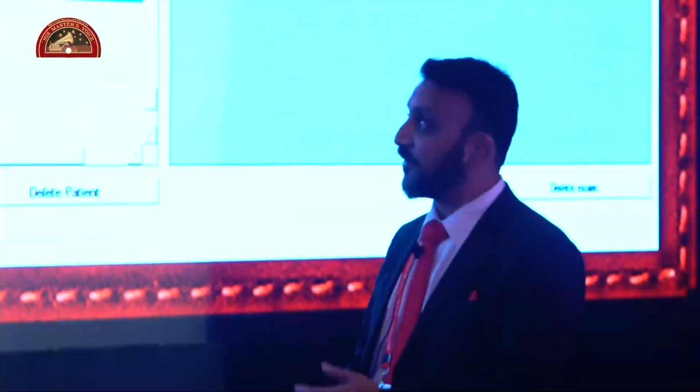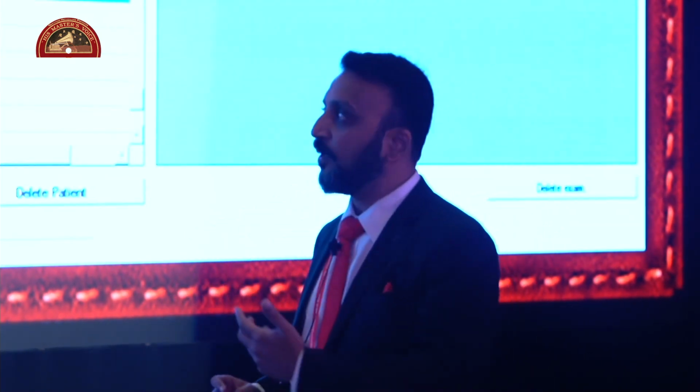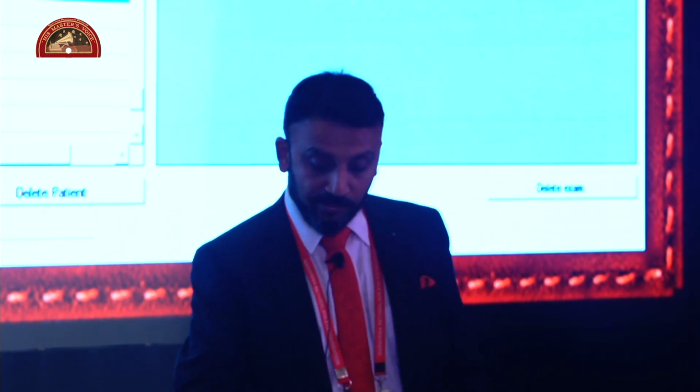So basically what was happening here was the cornea had asymmetric astigmatism, and the topography can pick up this asymmetry, whereas our humble keratometer just measures the meridians and averages out. That's the reason why we missed out on that irregularity, and we put a toric IOL and ended up with a problem there.